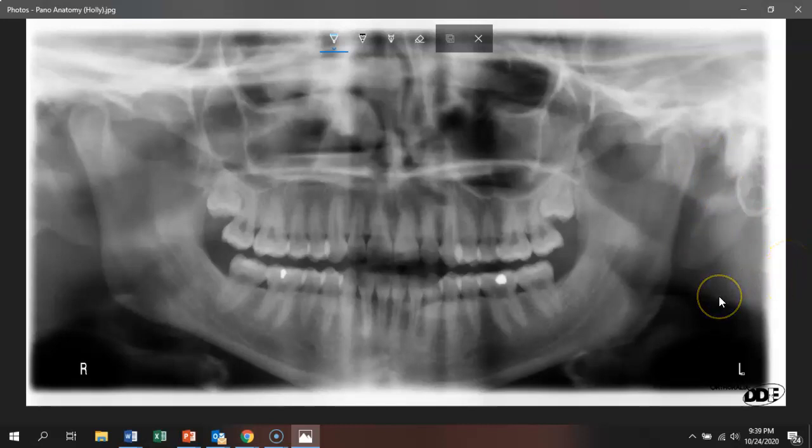Okay. Can you draw your finger down along, or point to the area of, in general, where the mandibular foramen would be? The right side is probably a little better because there's less airspace kind of blocking your view. So on the right side, where in general would you point to the mandibular foramen?